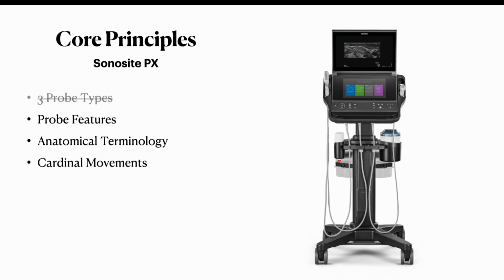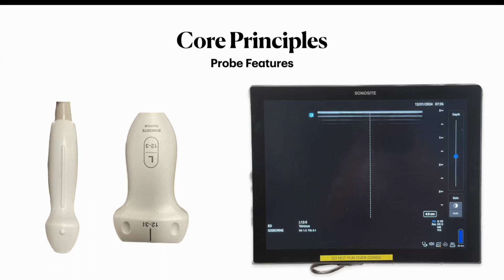Moving on to a few essential probe features. On each ultrasound probe, you will notice a small bump on the side, which corresponds to the dot on the ultrasound screen. This is known as the probe indicator, and you always want the probe indicator to face to the left as it does on the screen, so you will be properly oriented.